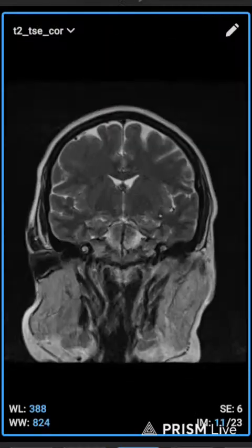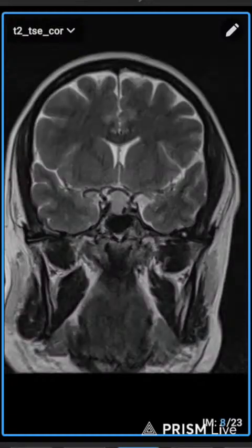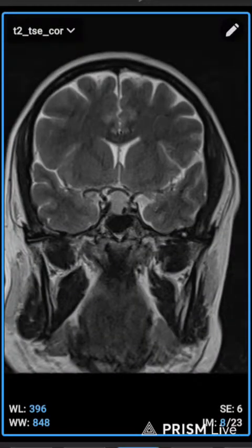The axial scan is not properly showing the pituitary area. It's just the idea of the pituitary. Normally we don't need to add an axial sequence in the pituitary area. We just screen the brain normal sequence. If the doctor has advised pituitary, we just see the brain is totally normal, so that's why we added the brain sequence in pituitary.